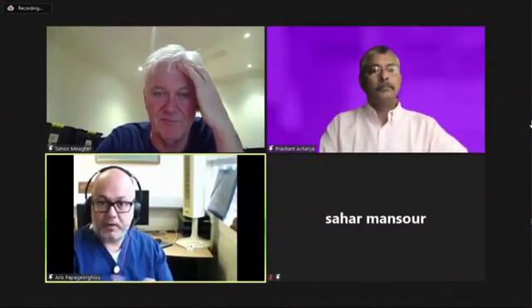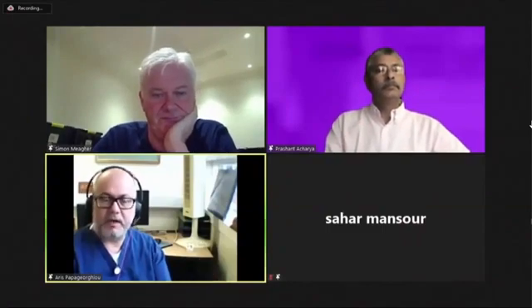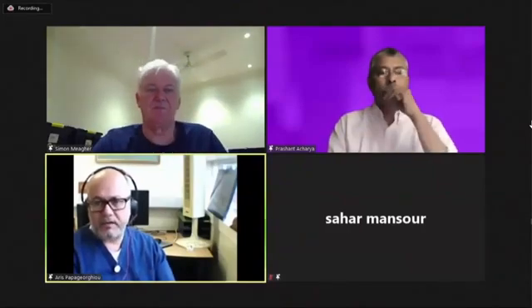And we're talking about the sort of growth restriction that you see at 22, 23 weeks. So the AC will also usually be already below the 50th centile, but may well still be within the normal range. So they may actually present as a query short femur isolated because the AC is still within the normal range. Femur length is below the 5th or 3rd centile, as is the humerus. And the clue is really in the Dopplers.